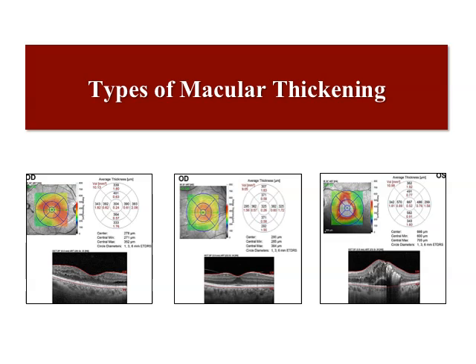For other devices measuring above the retinal pigment epithelium, for example the Topcon device, the central macular thickness or central subfield thickness is about 250. In the parafoveal ring, it's 300 micron, and in the perifoveal, it is again 250 micron. So it is important to know what device you are using and what its normative database refers to.